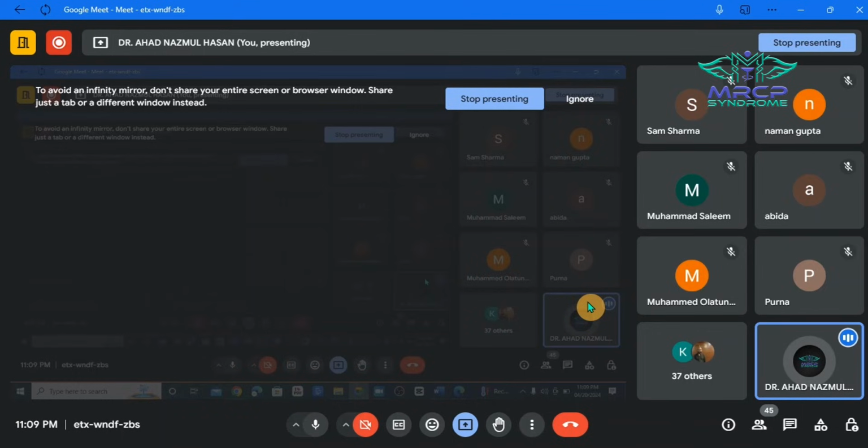So in case of CT scan images, the slices are taken at an angle, but in case of MRI, you can have the true axial slices. So in case of CT scan, the structures near the top of the slice are more rostral than the structures near the bottom of the slice.